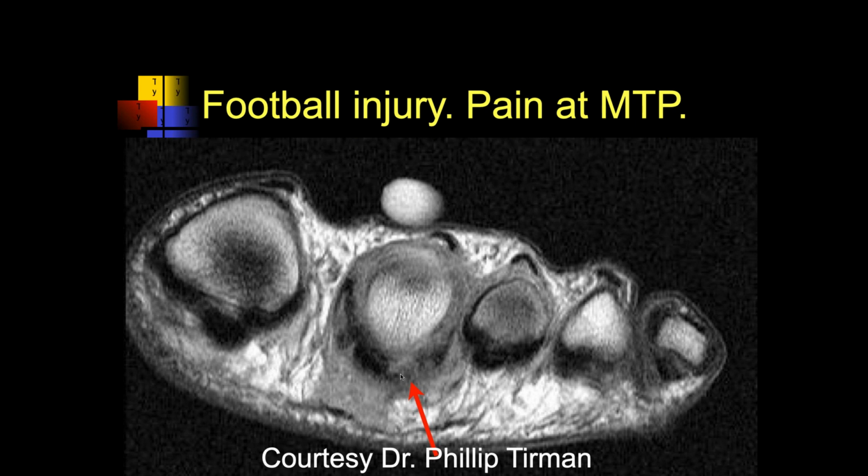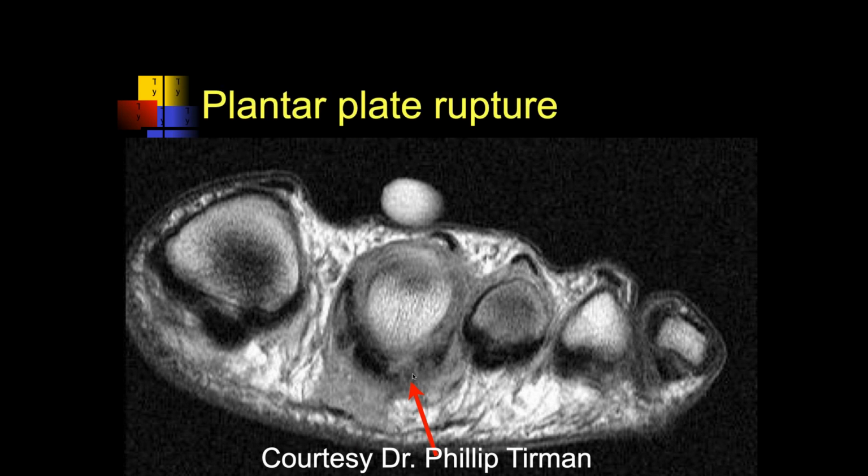There's a portion Philip thought was torn, and they actually went in surgically and repaired a tear. But it does look like some of that flexor tendon is intact, but there are segments here. It doesn't look like it's centered over the bone, so I think some of the surrounding stabilizing attachments were torn. Yeah, it's subluxed, right.